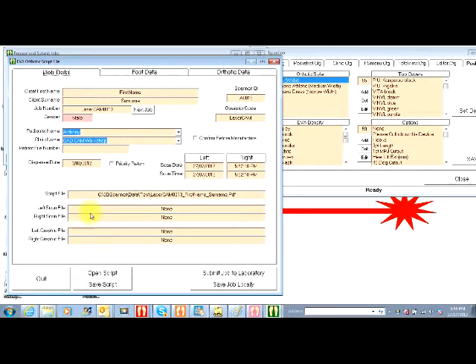Down here, if I load it up 2 feet first, you get your left scan, your right scan file, your left graphic file, and your right graphic file. The dispense date, we have a priority return. They can click that, they put the date in, we make sure we get it back on time. If you remember, that's the operator code and the scanner ID.